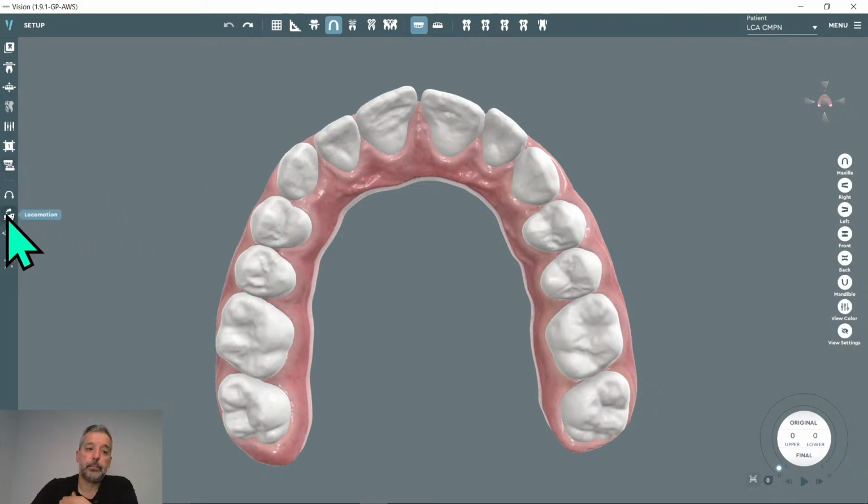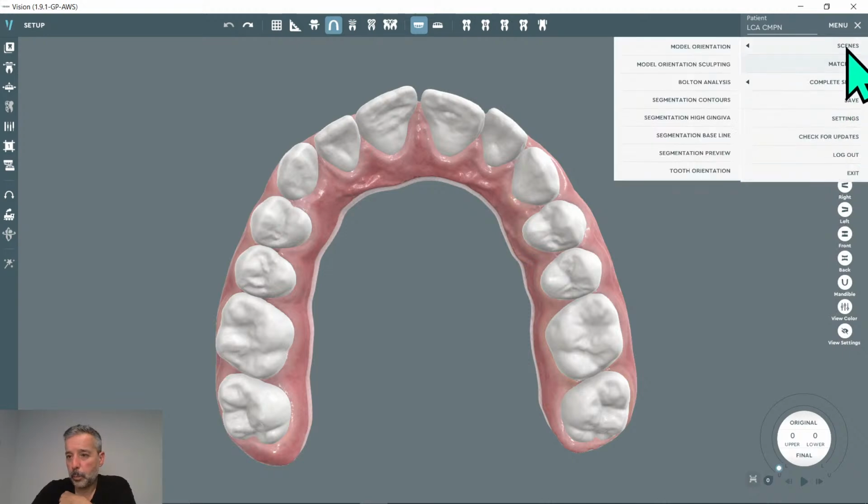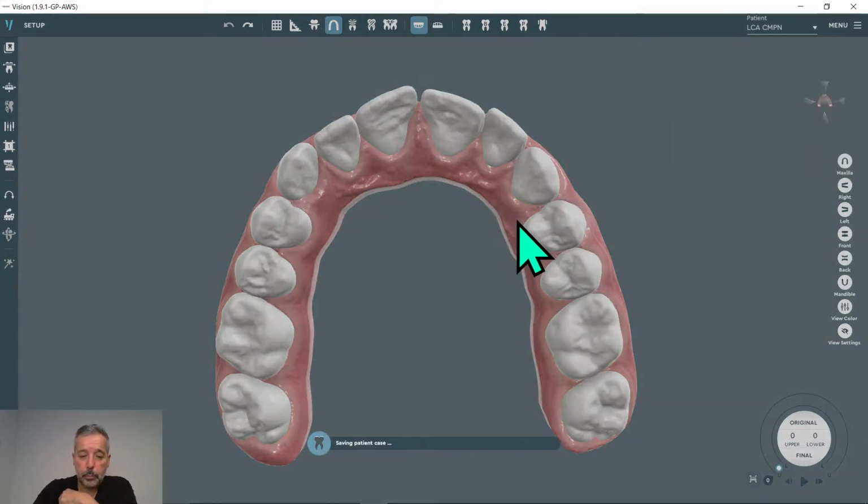Articulator, locomotion, we can talk about that. The axis of the tooth, different axes, same as the software we saw two weeks ago, and also auto setup. Now we can talk a little bit about managing the model before starting the movement, just five minutes.